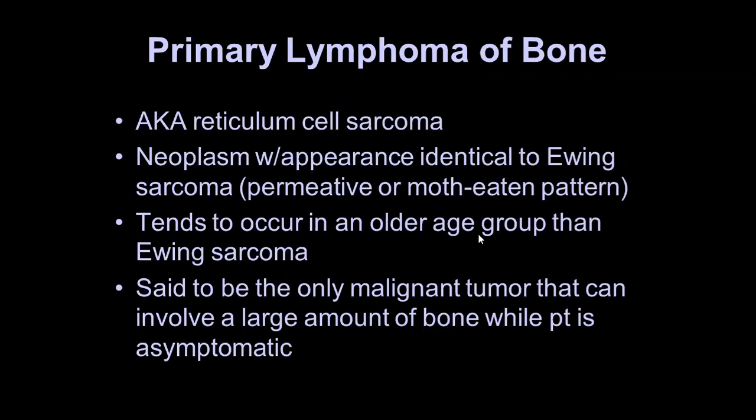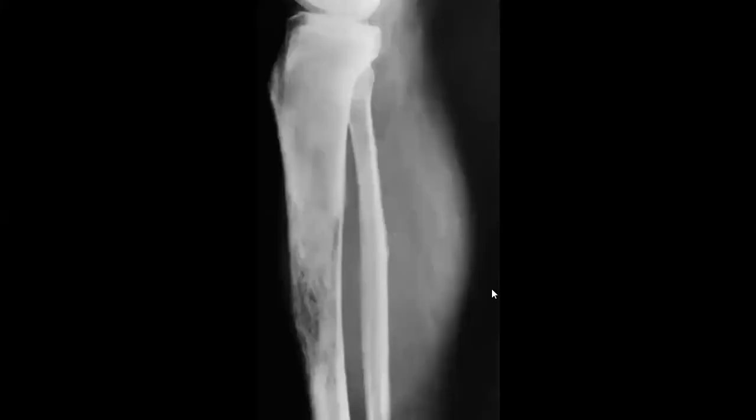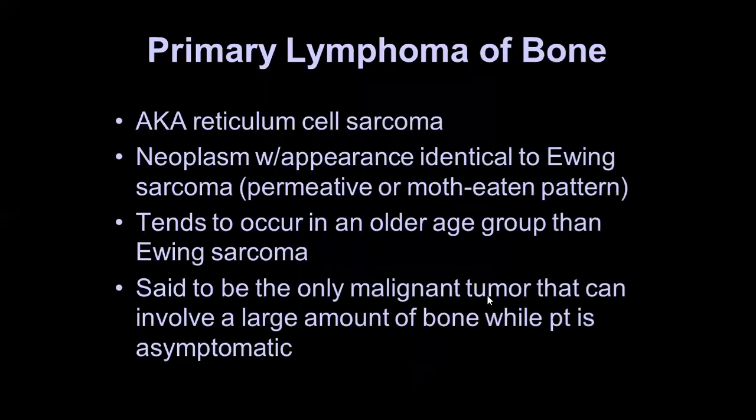And sure, you will find the age group. And yes, lymphoma can present with everything, as you will see later. It can make sclerosis, lysis, a permeative lesion. Lymphoma and metastasis can behave like everything. So that's why you can almost put lymphoma and metastasis in every differential diagnosis. Okay.